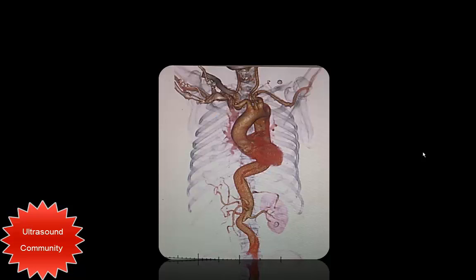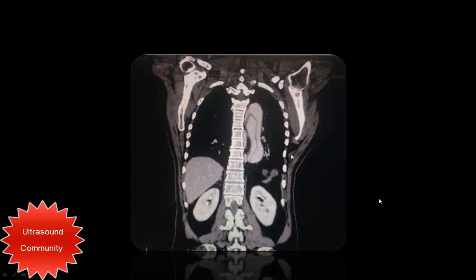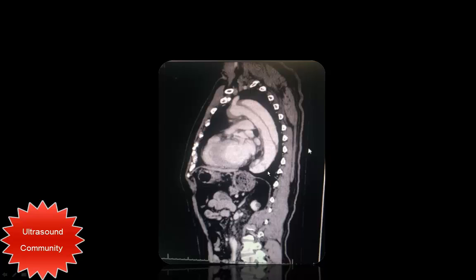And there they did CT angiography and it shows really a bit unusual anatomy of the aorta. It was a tortuous course, and that explained why we could not find the longitudinal axis of the aorta in one view. And they found the dissection started from the arch of the aorta until the abdominal aorta up to the right femoral artery, and this is the dissection in the CT.